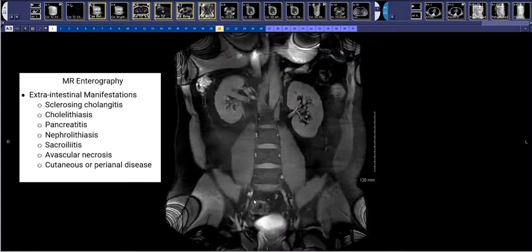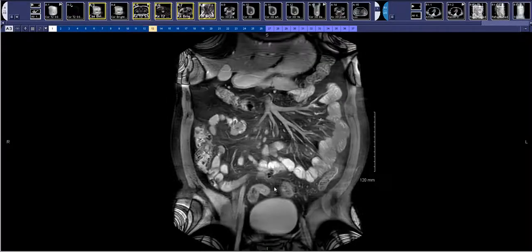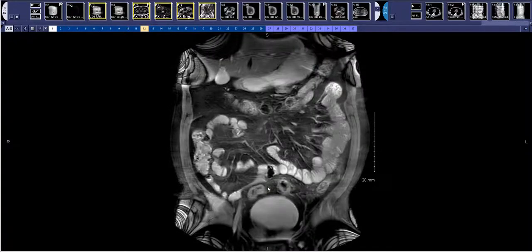So describe or bring attention to those areas. Overall, we're giving a pretty subjective assessment of the disease burden, and we just want to describe the number of features present, their severity, and their conspicuity, because those features correlate with the level of active inflammatory disease.